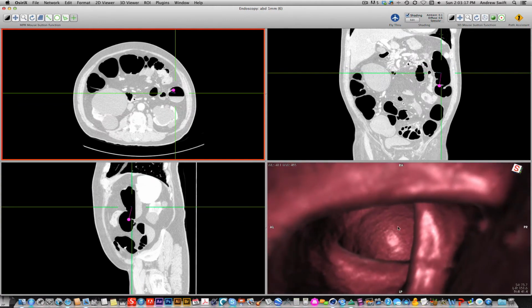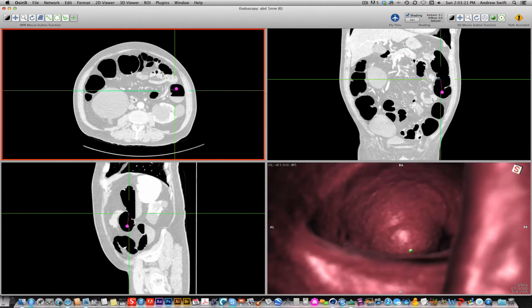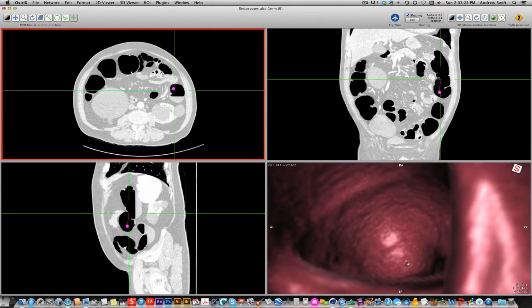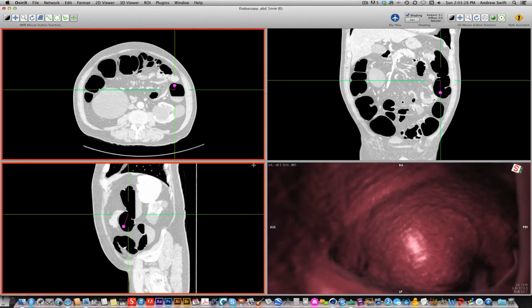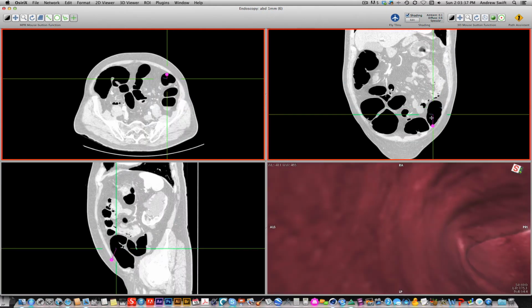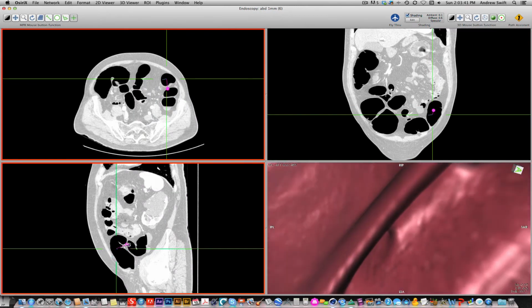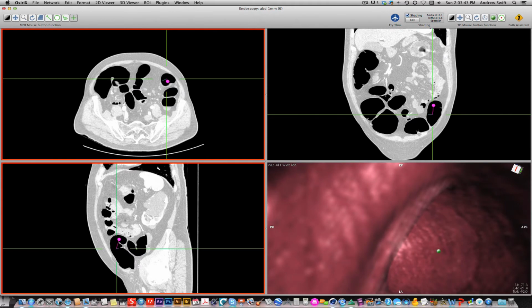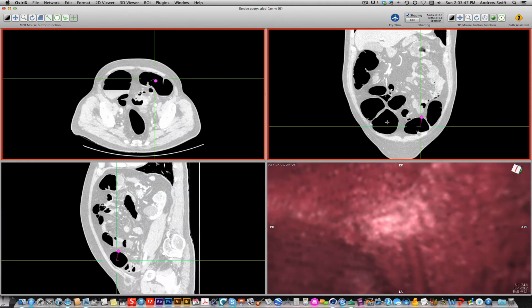And you can actually shift and pan and shift and drag to move inside this window. I haven't done it in a while. Or you can navigate from this view. And then there should be a way to pan through the views. Yeah, so if we go over here, let me see here. So we can turn this around. But basically this is your heading, and this is what you see in the viewport, I realize. And then you can still use your window leveling.